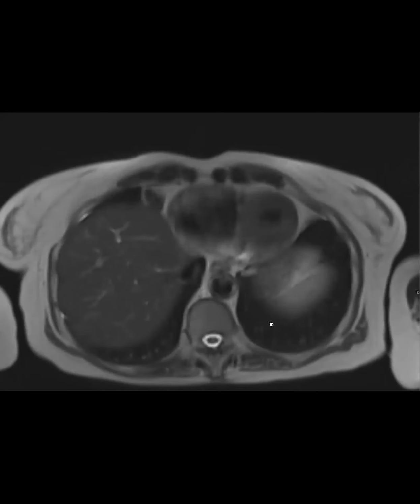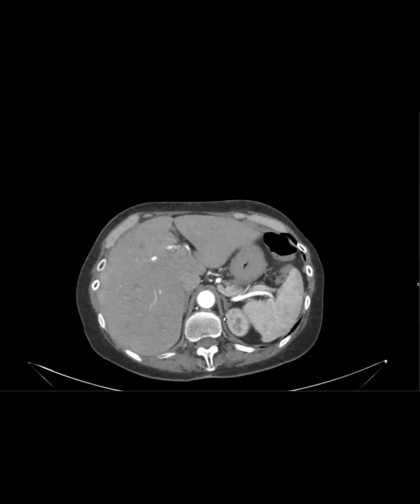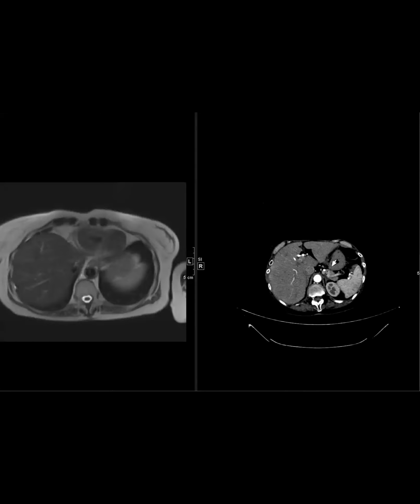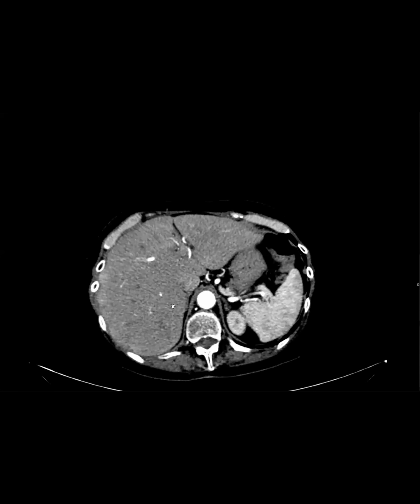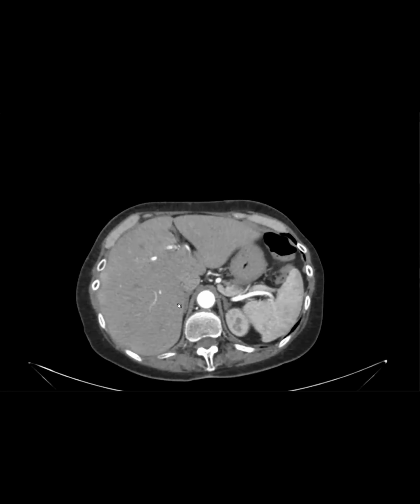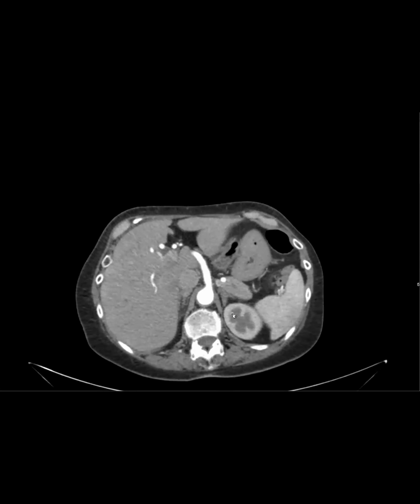Looks okay. Did they bother with an endosonography and biopsy, or was it straight to the OR? No, we were convinced enough about this, and so got a distal pancreatectomy. And I was actually very surprised that it was a grade 2 neuroendocrine tumor, because a lot of insulinomas are benign, grade 1. And I think, if it weren't for the symptoms, I definitely might not have seen this.